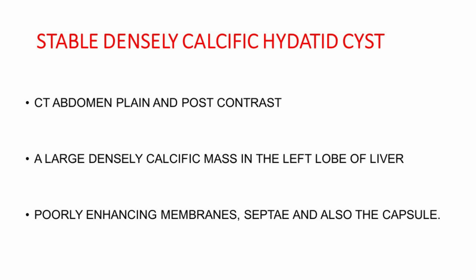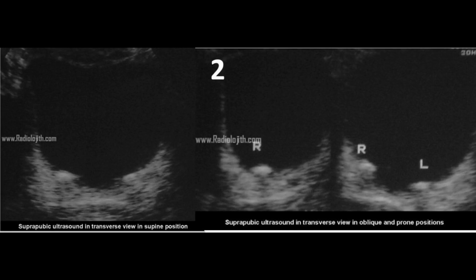That's the answer. Now I am giving the second case. Take your time to give the diagnosis. This is ultrasound pelvis focusing the bladder. If you want time, you can pause the video and you can go through that. Now I am giving the answer.